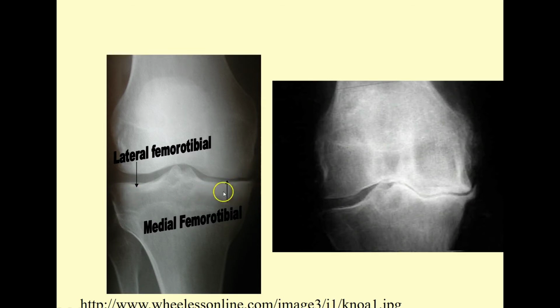Again, look at the bone density here, bone density over here. You can see it's thicker generally. So again, decreased joint space, subchondral sclerosis, and a small osteophyte. Very typical, and again, mostly occurring in that order.